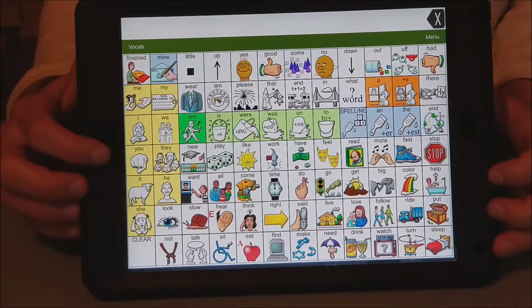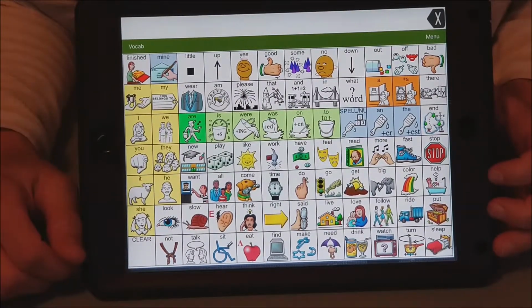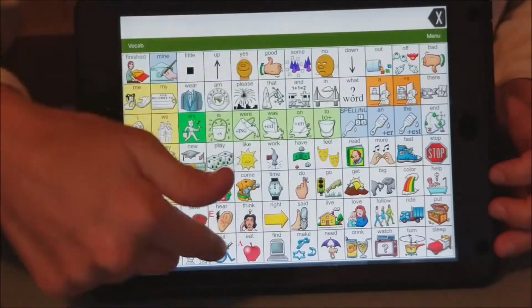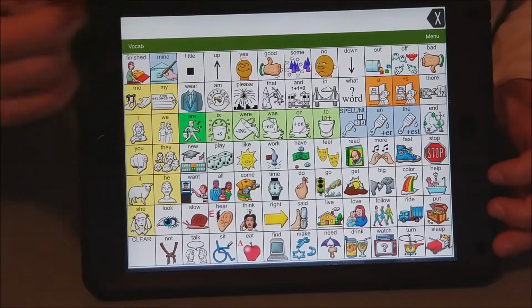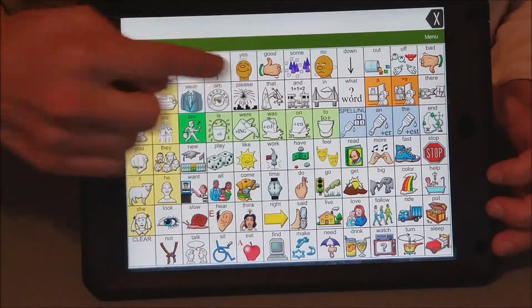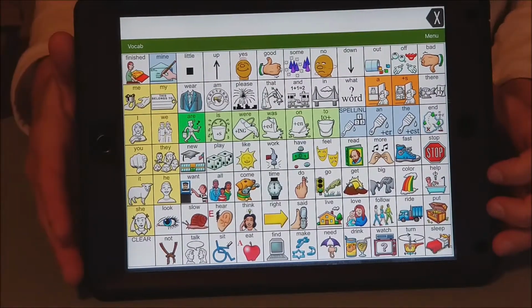And the LAMP website recommends a successive learning approach by first teaching one-hit buttons. So maybe we're just working on the words eat or the words go. And I'm not going to hit the buttons for the one-word touches because this device is set up with multiple touches, which I'll show you next. So after your child or your client masters one hits on the buttons, then you're going to go into multiple hits to get through the buttons.